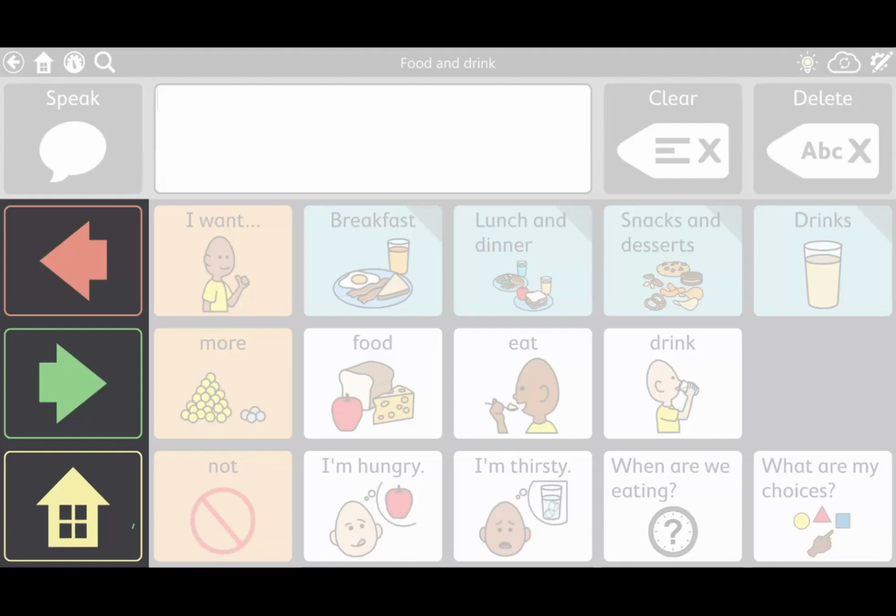So thinking about themes, these were really designed so once you are in a theme or folder, if you will, the communicator should be able to express their wants and needs in 2 to 3 word phrases. And those can typically be composed in only 1 to 3 selections. So that makes for communication that's simple, easy, and quick to learn and use in the moment.